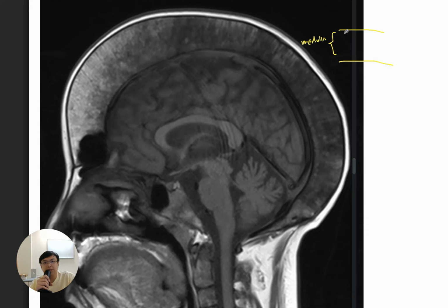And within the medulla, you know that there are different kinds of trabeculae forming a meshwork, and then eventually you will also have some red marrow inside the medullary bone. Of course, we have also mentioned previously that there is no absolute red or absolute yellow marrow. There are always components of fat, which is yellow marrow, and also hematopoietic cells, which is red marrow. They are just different proportions, and in red marrow we expect to see more hematopoietic components.